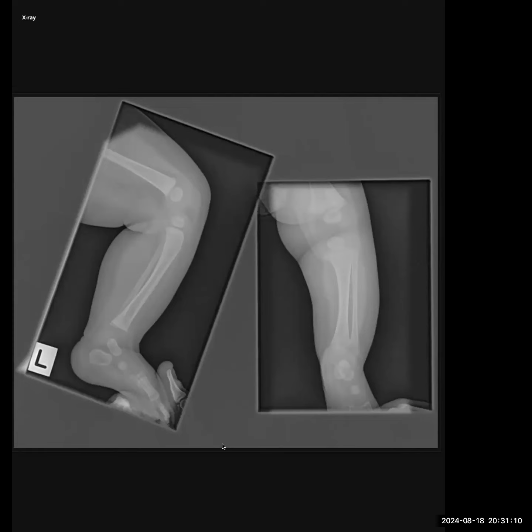You can ignore that. Looking at the rest of the bones, the distal aspect of the femur on the lateral projection, I'm suspecting there to be a mild angulation.